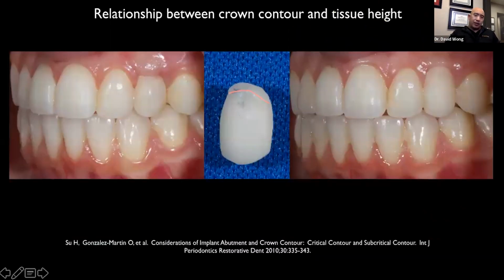But don't forget, if you can bring the gums down, you can also bring the gums up. So a situation like this is also from Barry. If you look at implant number 11, this patient usually is referred to a periodontist, or even with the general dentist, they'll want to get their laser out or something and remove that extra soft tissue.